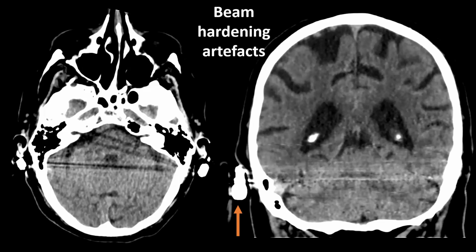They basically reflect a lot of the X-ray photons, and only photons with very high energies go through them. We call those beam hardening artifacts because as only photons with high energies move through them, the beam is hardened. So a relatively high amount of energy is received by the detector on the other end, and this creates these hypodense or black lines in the image.